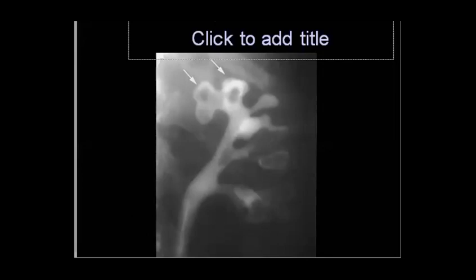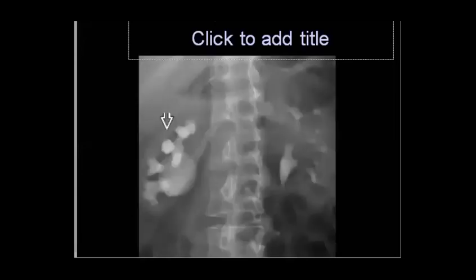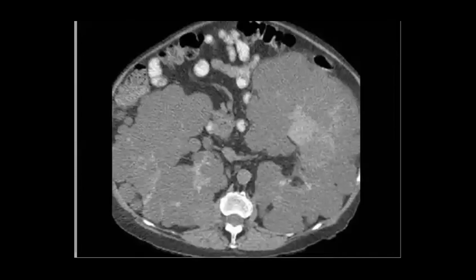Kareem, welcome back. Okay, and what about this one? It is sloughed papilla with club deformity. Yes, clubbed. So you have many different appearances. This one we mentioned many times, even in the practice, a very easy one.